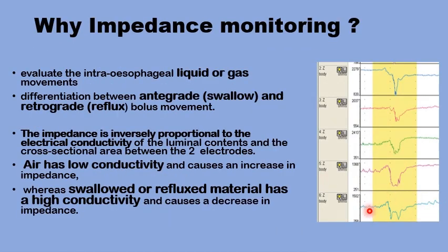The pH fluctuations over a 24 hours period would be shown in the lower segment of the chart. The upper 3 or 4 other segments of the chart would be reserved for monitoring the fluctuations in the impedance in the hypopharynx and in the esophagus. There would be pairs of electrodes in the hypopharynx near the upper esophageal sphincter, in the esophageal body, and above the lower esophageal sphincter area.